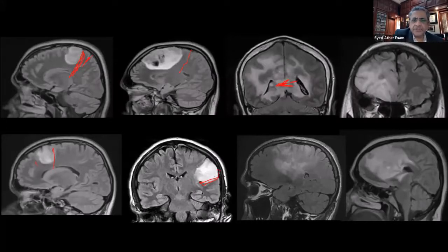And over here is the right frontal lobe. Here is a diffuse tumor extending into the parietal lobe also. You see this over here. Here it is extending along the corpus callosum, or maybe along the cingulate gyrus. So get as much information as you can. These are all FLAIR images, right?